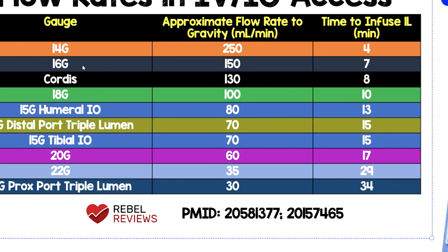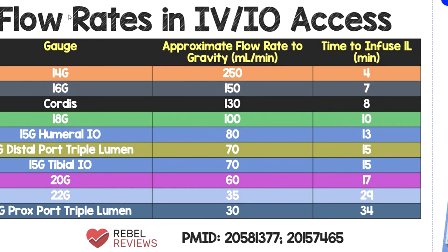We're looking at mass. We're looking at age groups. We're looking at what are we trying to accomplish? Are we dealing with a medical patient or a trauma patient? Okay, and so that is pretty much the video. I just wanted you to see how we select the appropriate size angiocath.